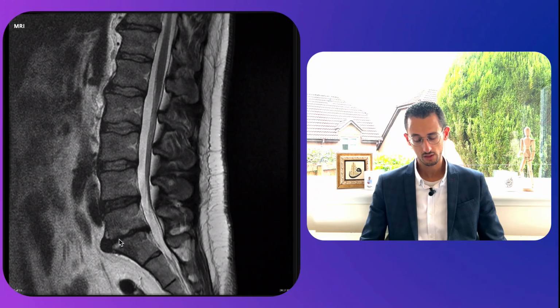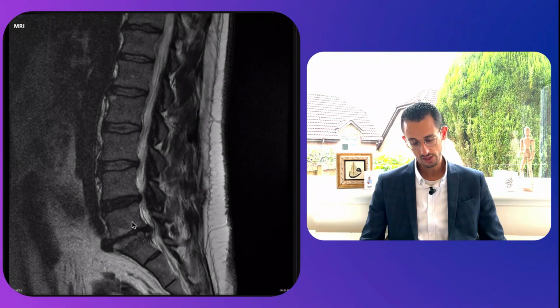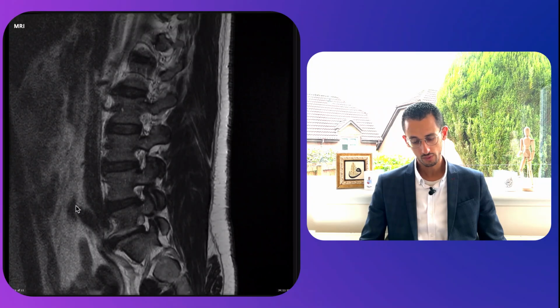The disc space here looks smaller. And if we look here, again, within the center, it looks all right. There might be a bit of disc bulge here between L5-S1. Again, there might be something here at L4-5. If we look lateral onto the nerve roots, that's a nerve root on one side, a nerve root, again, teardrop, teardrop, all looks fine. If we look on the other side, that's the teardrop, but actually there is something here. So there's something kind of grayish here, which is causing pressure on this nerve root.